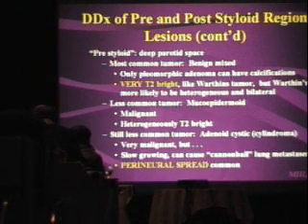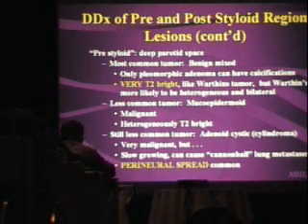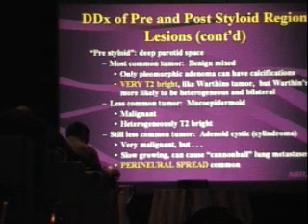If you see multiple T2 bright lesions in both parotids or both lacrimal glands or other salivary glands, if you biopsy one of them and it's a Warthin's tumor, you can probably just watch and wait and leave the others alone because they're benign. Okay? Any malignant tumor is still going to be T2 bright. The difference between pleomorphic adenomas and other malignant tumors is that pleomorphic adenomas are like hemangiomas in the liver. They have this very slow, delayed enhancement and kind of fill in from the periphery.